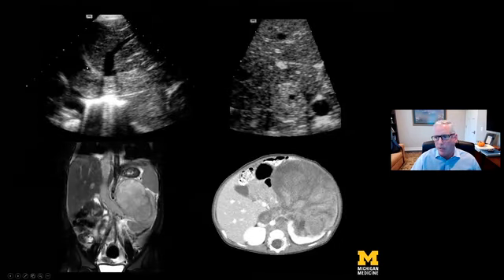This patient, which I had quite some time ago, has a very nice ultrasound example of one of the problems with Wilms tumor, which is it likes to have vascular invasion. If we look down to the CT, we can see the claw sign and the large heterogeneous mass on CT for this Wilms tumor, and we can actually see tumor thrombus extending in the left renal vein over to the IVC. In this particular patient, a different patient, this is a sagittal image.